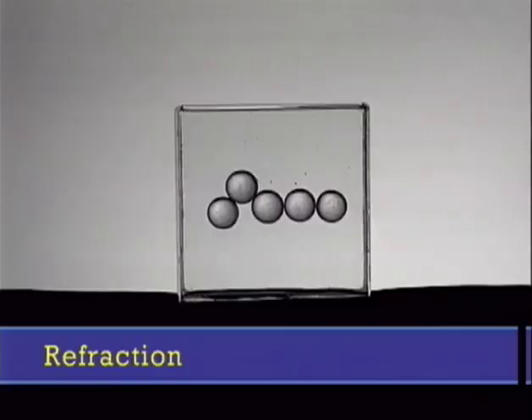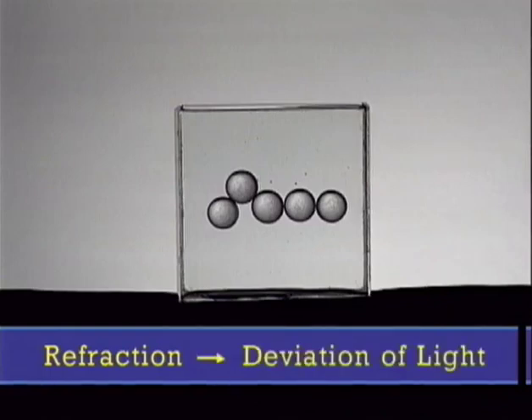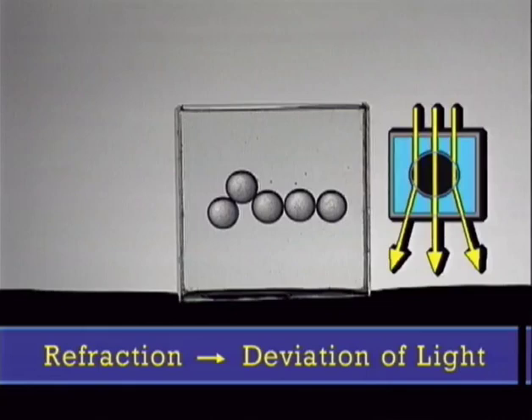For detecting transparent objects with a different index of refraction, the deviation of light coming from the back is examined. This is demonstrated here by glass balls in the transparent cube, which have black margins, because light coming from the bright background has been refracted away.